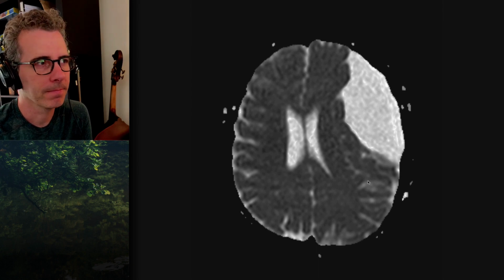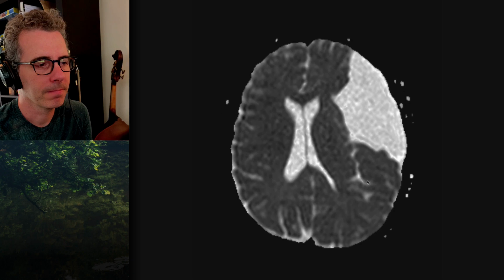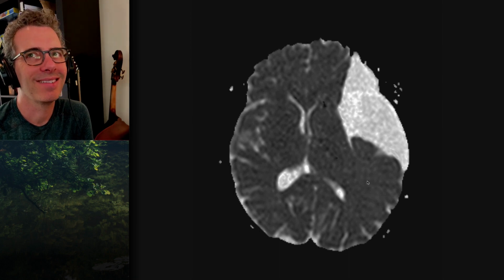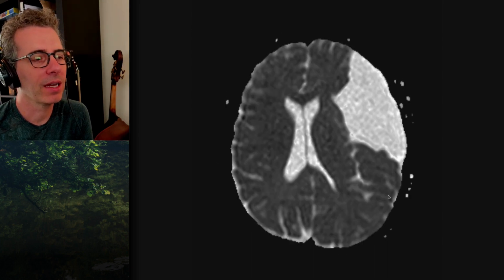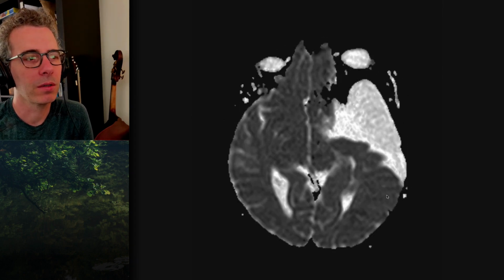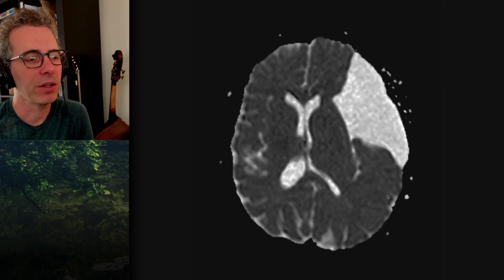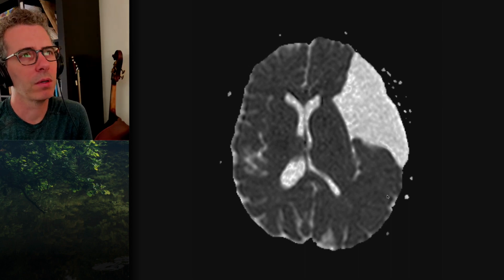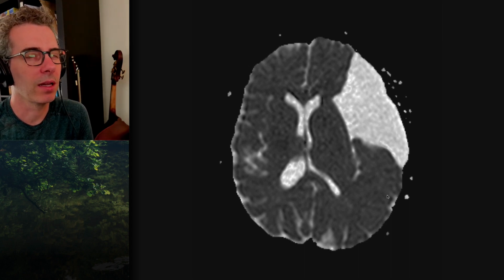Well, it distorts the contour of the lateral ventricle and compresses it and almost brings the two surfaces together. Because effacement does not mean distorted, does it? No. It means obliterated. So if you say that a ventricle is effaced or a sulcus is effaced, it means it's gone. And here the ventricle's still there. It's narrowed. You can say partially effaced if you want. Partial effacement, which is kind of like saying partial obliteration or somewhat pregnant, I suppose.